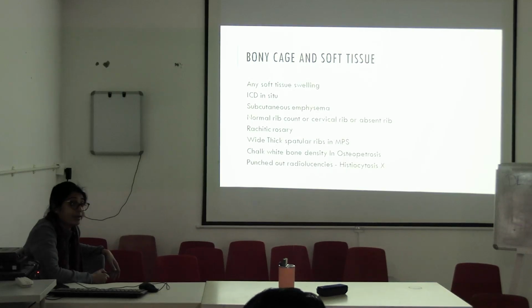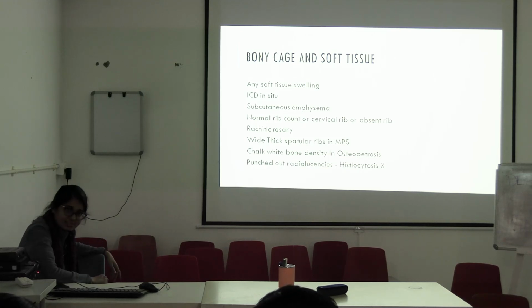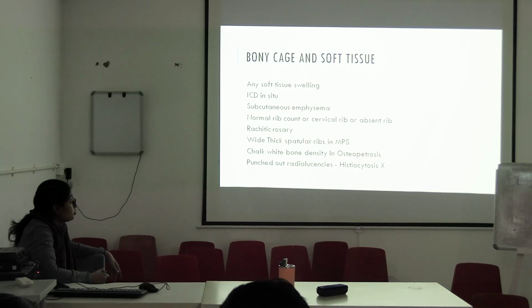rachitic rosary কি হয় বলো? What is rachitic rosary? কি হয় সেটা? Rickets এ হয়, but what is the structural problem? Rosary beads দেখবে, পড়ে দেখবে আজকে ক্লাস হয়ে গেলে, what do you mean by rosary? ঠিক আছে, rosary কি পড়ে দেখবি, ইন্টারেস্টিং। এবারে you will have to look at the structure of the spatula, whether it is wide, thick, rib structure.